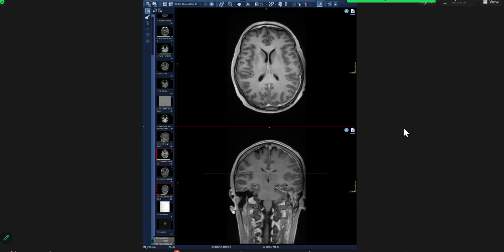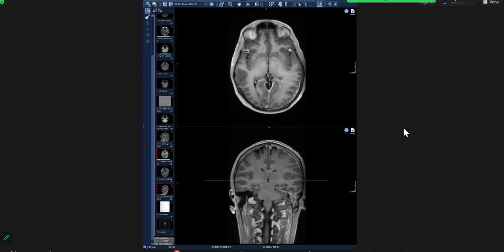So just tell me what you're thinking and what you think would be the next management. Ma'am, I'm thinking that he's suffering from meningitis. Do you see a cause on these images? I told you he's not immunocompromised.